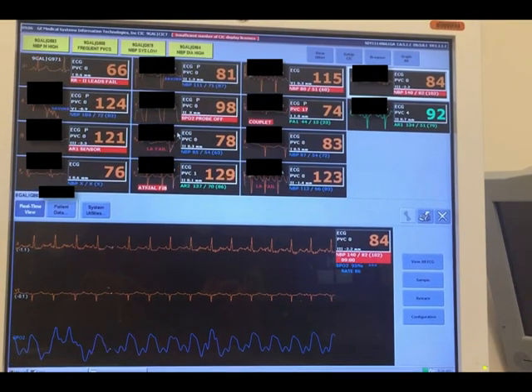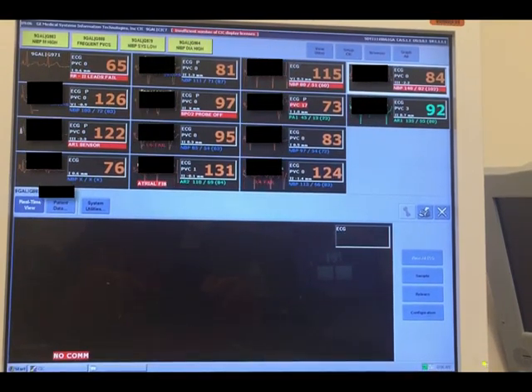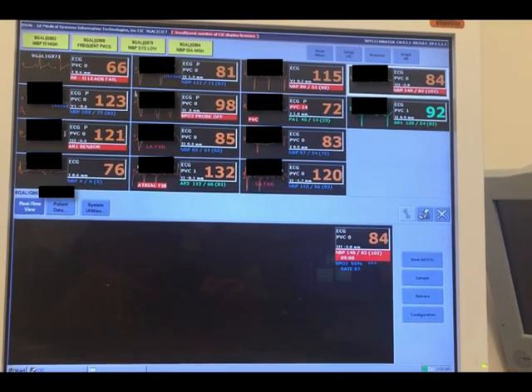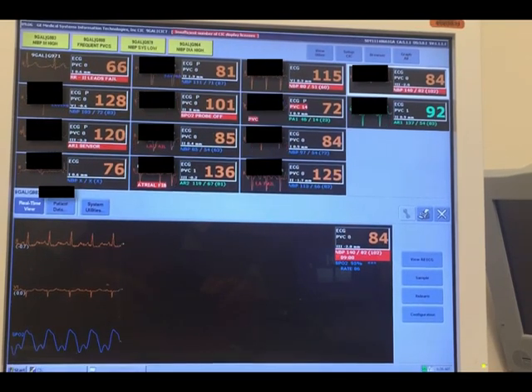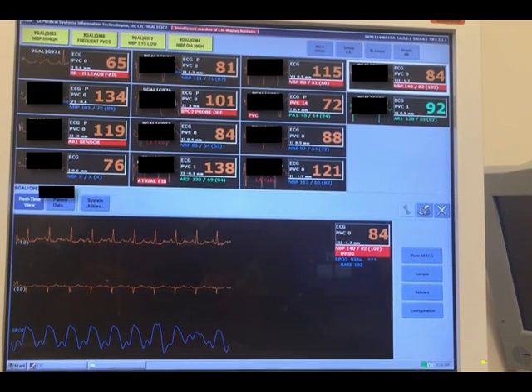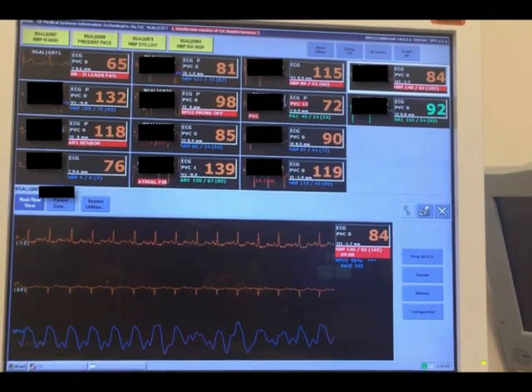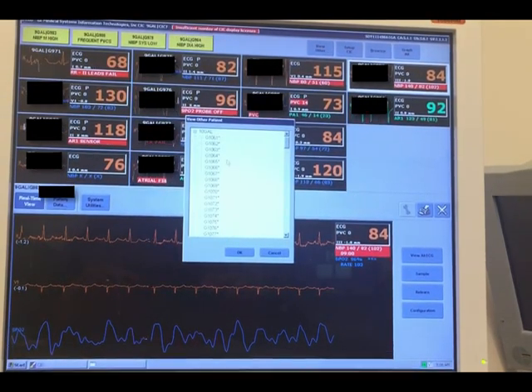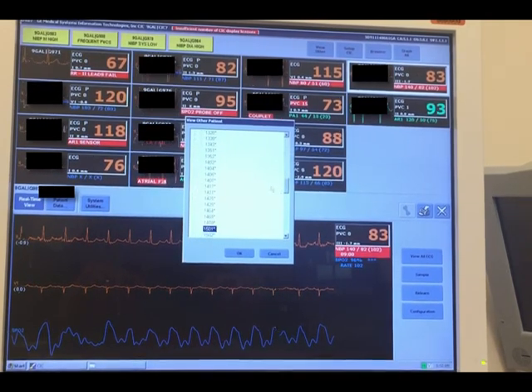Telemetry monitors located on almost every inpatient unit will display real-time telemetry for the patients located in that unit. Clicking on a specific patient will enlarge that patient's real-time heart rhythm. For ICU patients, in addition to the heart rhythm, oxygen plethysmography and waveforms of indwelling lines, such as an arterial or central venous catheter, will also be viewable. By clicking on View Other, a drop-down menu will appear through which a provider can pull up the real-time telemetry of patients located anywhere in the hospital.